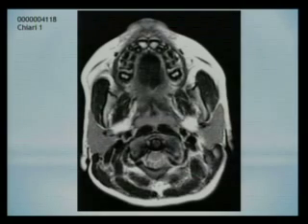So this is a Chiari 1, and I'm showing you the image where it is least obvious. But should you be presented with a standard axial sequence, you look at the first slice here, and this is in the cervical spine because you see the odontoid process, and yet you see tissue here behind the cervical cord.